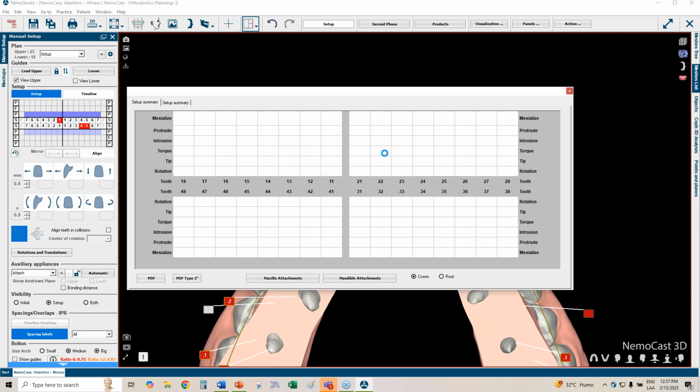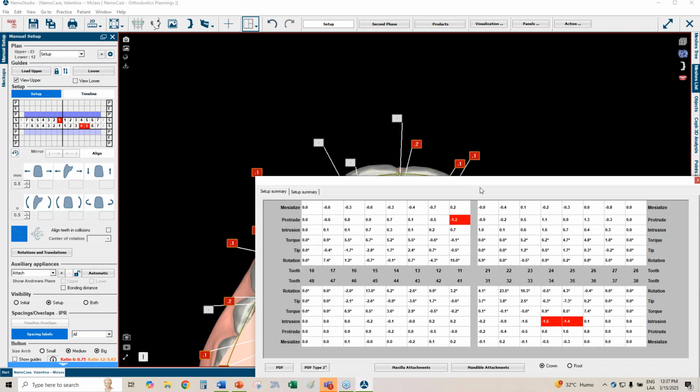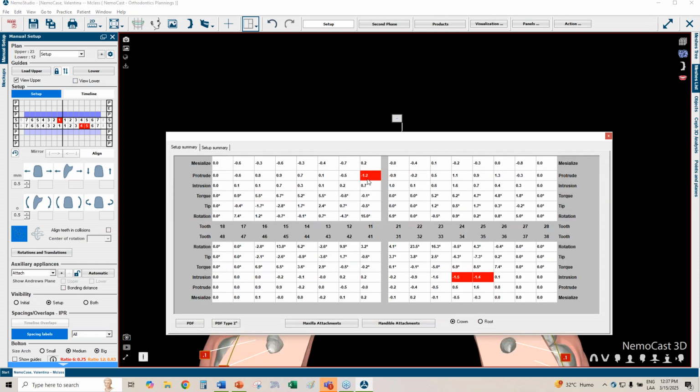It's normal that when you're loading it, because it's loading the full information, it closes and then you reopen the printer icon and it will display the movements, because it's feeding off the actual setup that we created, right? For example, our hardest movement on the incisor is the retrusion.